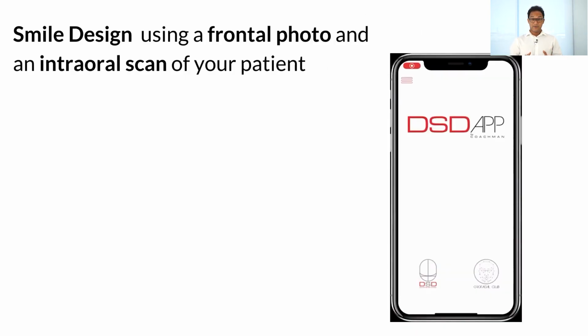With DSDApp, we also have an advanced option of smile design, which is by integrating a frontal facial picture of your patient and an intraoral scan of your patient. The process is almost the same. The only difference is that now when you integrate the intraoral scan of a patient, you have to calibrate that STL and superimpose it over the patient's picture. So let me show you how it works.